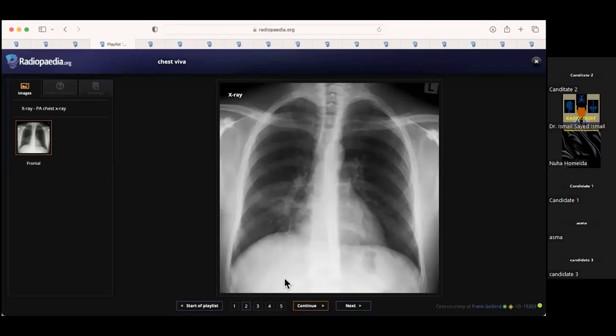So this is just a simple case of middle lobe collapse, and it shows the importance of the lateral view. Whenever you see an ill-defined right heart border, you need to think of three things: right middle lobe consolidation, and as you said, collapse, or pectus.